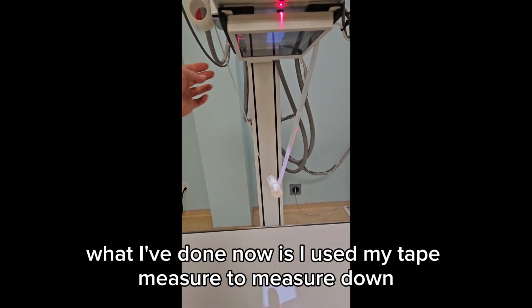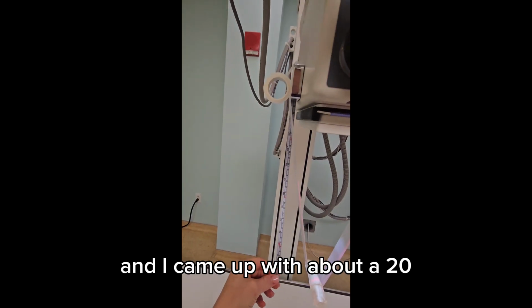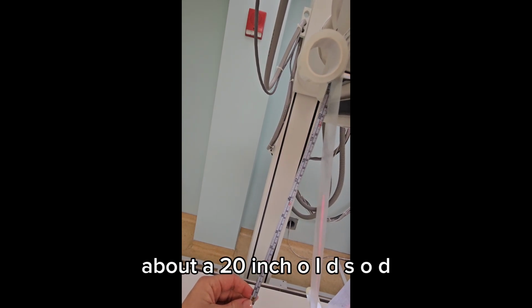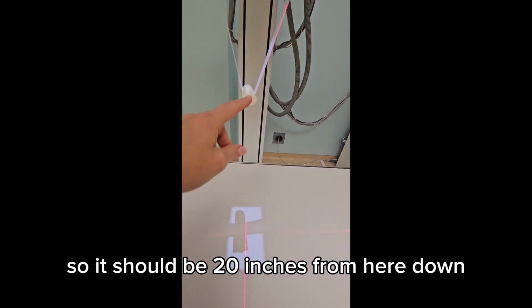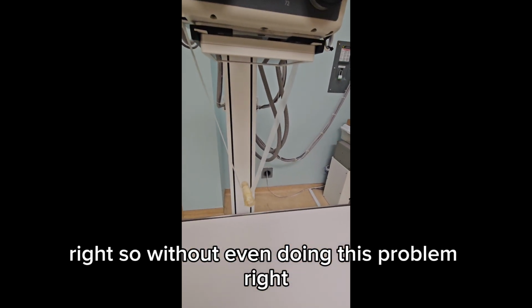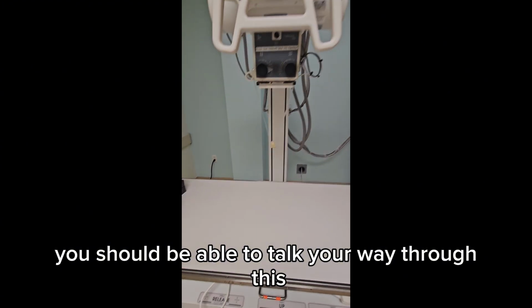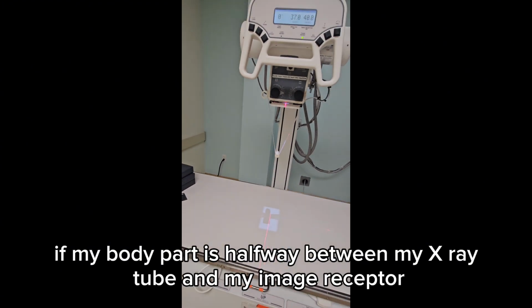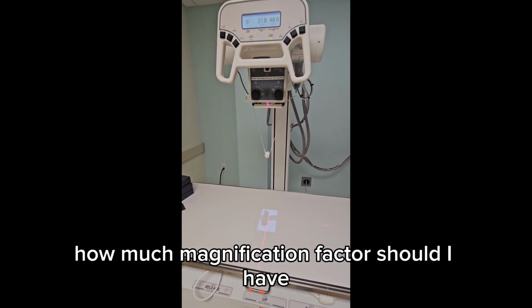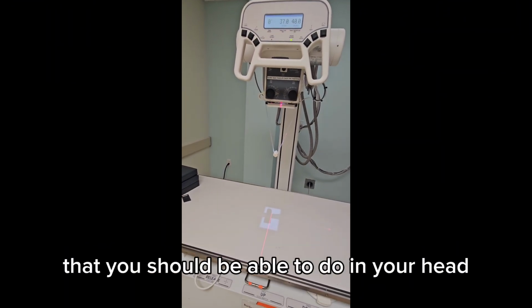So literally what I've done now is I used my tape measure to measure down, and I came up with about a 20, it's not quite there, but whatever, about a 20-inch OID SOD. So it should be 20 inches from here down, and it should be 20 inches from here to the x-ray tube, right? So without even doing this problem, you should be able to talk your way through this. If my body part is halfway between my x-ray tube and my image receptor, how much magnification factor should I have? This is the kind of stuff you need to do for Quiz Bowl. They're going to give you these kind of problems that you should be able to do in your head.